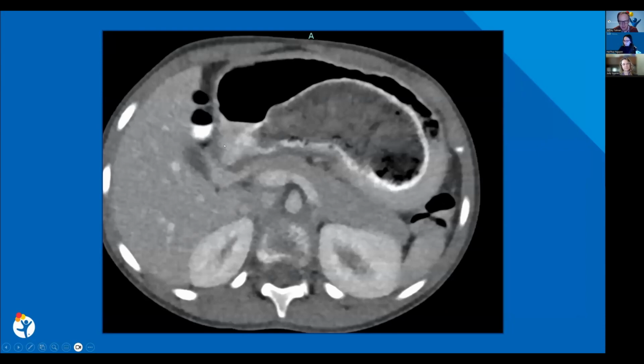The patient subsequently had a CT at the request of surgery just to get a different look at it, to prove that it was actually there before they went into surgery. So this is just something I think you have to be aware of. This can mimic air in the stomach, but it really helps to have the physical exam. I told the sonographer to go feel around on the patient's stomach, to feel if she could feel anything hard there, which she said she could. So she was palpating this big mass here. So this was a case of a bezoar.